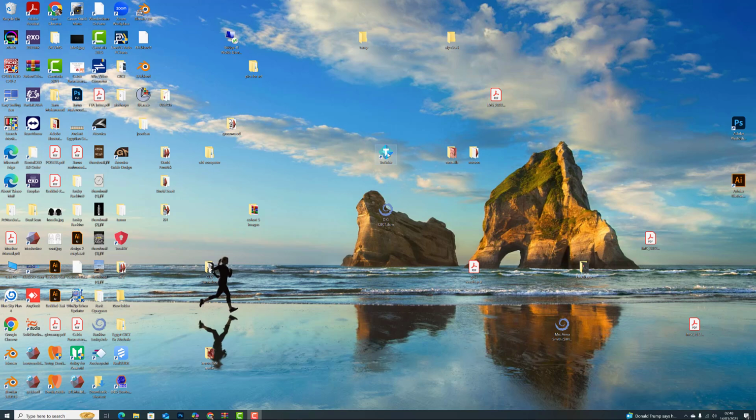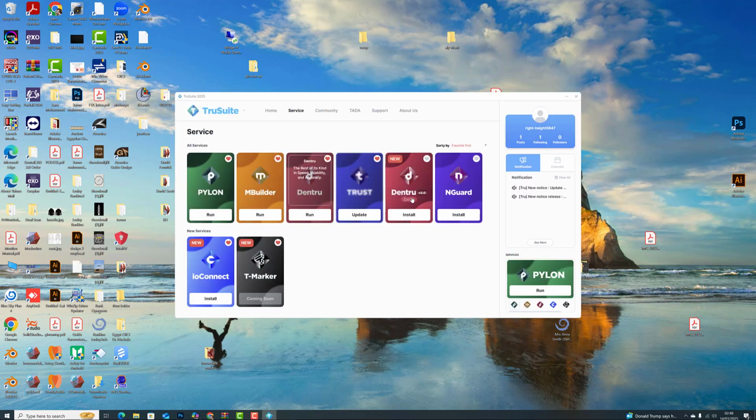it up on your desktop, it will look like this. So you click on it, and then you'll get all the applications here. There's the Pylon, which we're going to discuss in this video. There's Model Builder, there's Dentru for dentures, there's Trust, that's for splints, I think, or well, I don't know, I don't use it. The IO Connect is a lovely software where you can actually scan through the software using the IO Connect kit, which has been released recently for full arches.